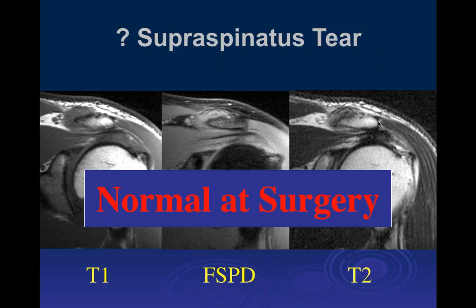We've seen only some of these, but in this particular case, I would still just call this a complete tear. Sometimes, if you have fluid in the joint space like an arthrogram, you can occasionally see that the bulk of the tendon is torn and retracted, but you can have a sliver of inferior surface still intact if you have contrast between the bone and the inferior surface.